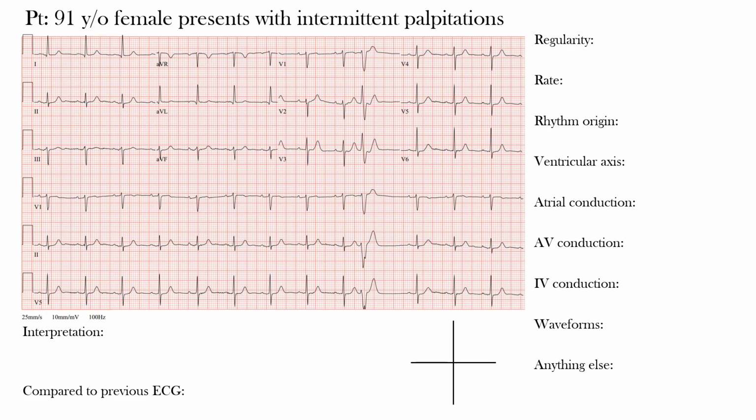On the right side of the screen, you'll see a list of different areas of the EKG that we'll go through before making our final interpretation. Now first, notice that there's the regularity of the rhythm. That is, are we dealing with a regular or irregular rhythm? And if it's irregular, is it regularly irregular or irregularly irregular? Next, we look at the heart rate, okay?